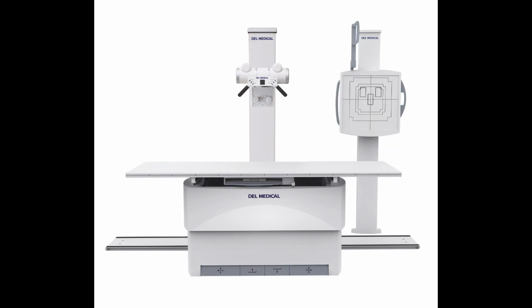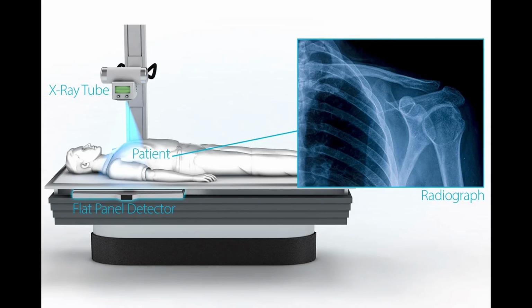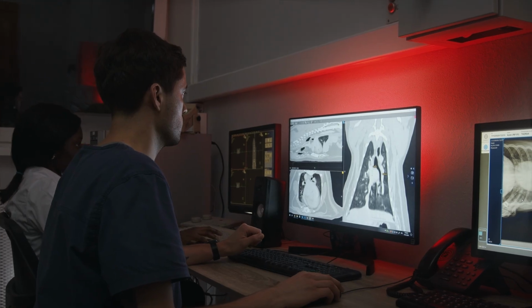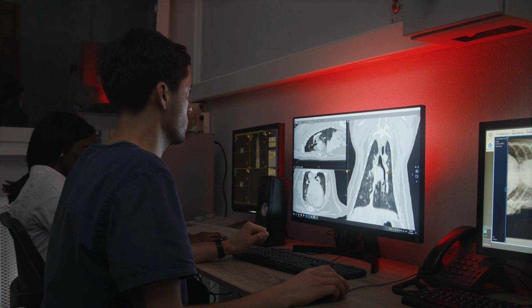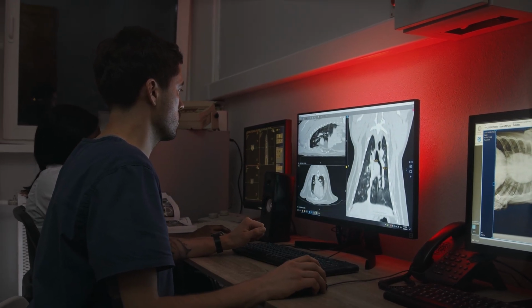Final summary. So guys, the radiology machine is made up of several seemingly independent components, but in practice, all of them must work together like an orchestra. The generator provides energy. The tube produces X-rays. The filters and collimator shape the beam. The table and wall stand position the patient correctly. The grid controls scatter. The detector captures the image. The AEC intelligently controls the dose. The control room manages everything. And finally, PACS and RIS integrate the image into the diagnostic workflow.